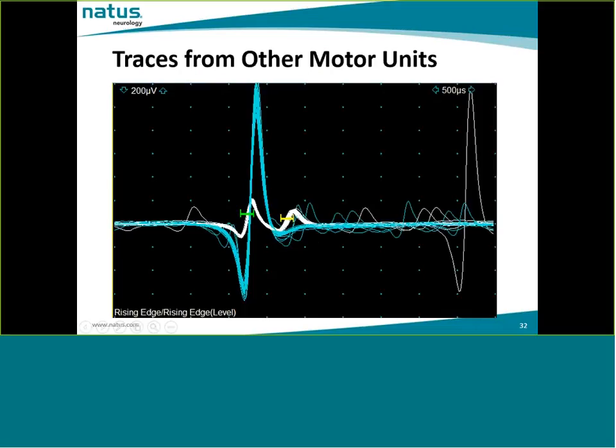So here is the first instance. I am interested in measuring the jitter from this action potential pair. But in the background, I have a higher amplitude potential, which also triggers the sweep. Notice that here we have a single action potential. This is of no use for measuring jitter. There is no time-locked action potential over here. But it does appear like blocking. Here we have an action potential pair, and on some sweeps we have a single potential. This is what we call a technical block.